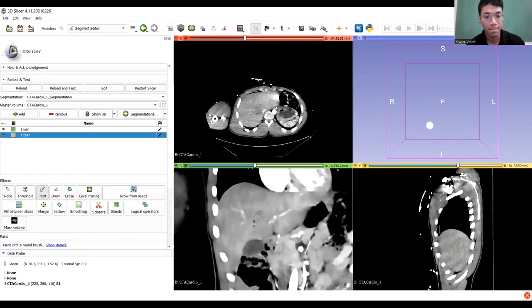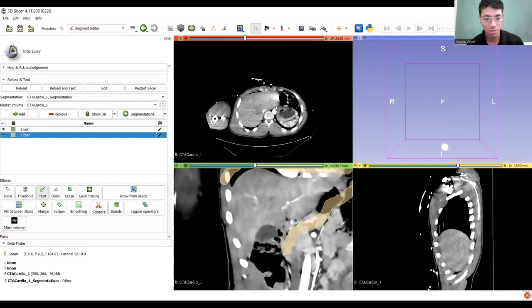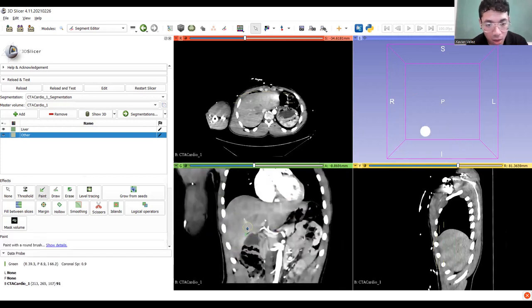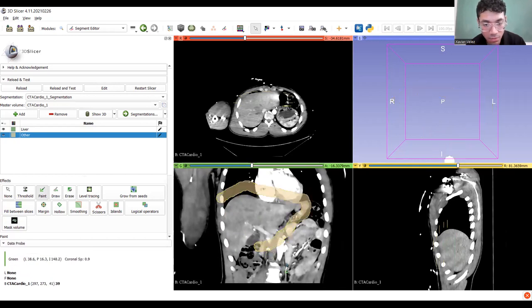So again, going to skip around a little bit and just get as much as I can. Sweet. Okay, we should be getting close to the edge. That's probably fine.